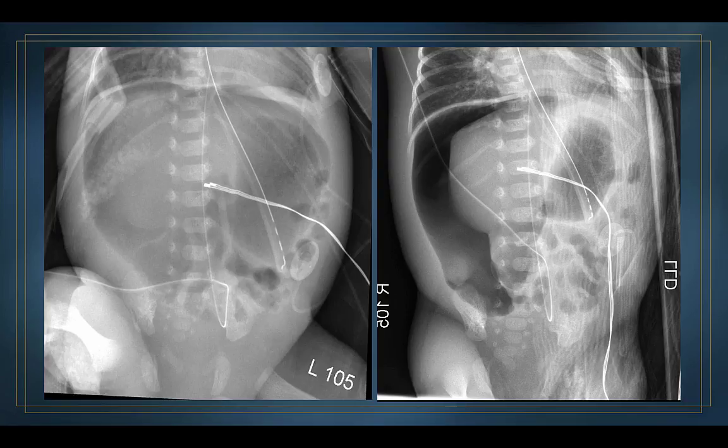I think this was also considered to be a spontaneous intestinal perforation, or SIP. Because even though this is intersecting at a 90-degree angle, it clearly has not perforated the stomach. But with time, especially if it's being pushed further under some degree of pressure, it will erode the gastric wall.